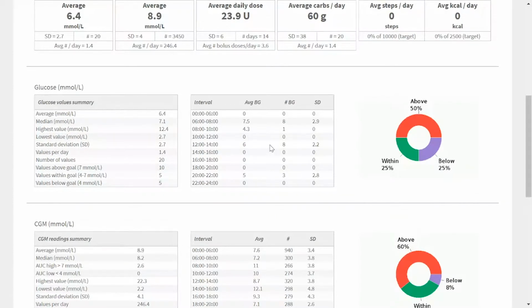So if a person is working 9 to 5, 5 days a week, over a 2-week period, we would have expected them to drive to work 10 times and driven back 10 times. So if they're working at 9 o'clock in the morning, we can see that we should have 10 tests here perhaps, or between 4 and 6, we should have 10 tests on the drive home. Obviously, it's up to the clinician to decide what is acceptable, but that is how you can use it to really gauge an understanding of how a patient is getting on.